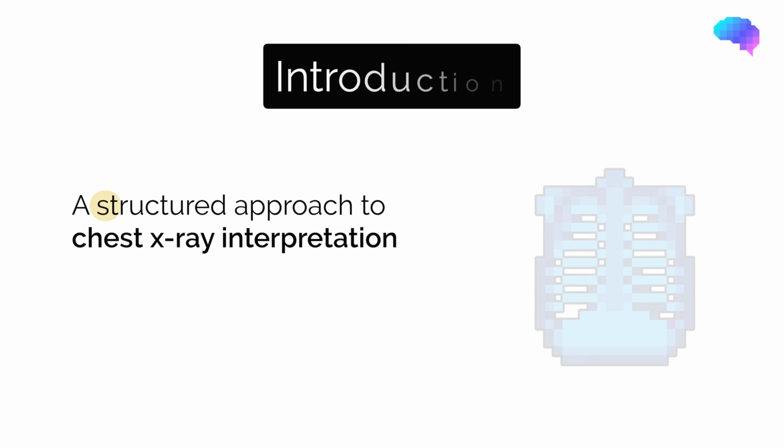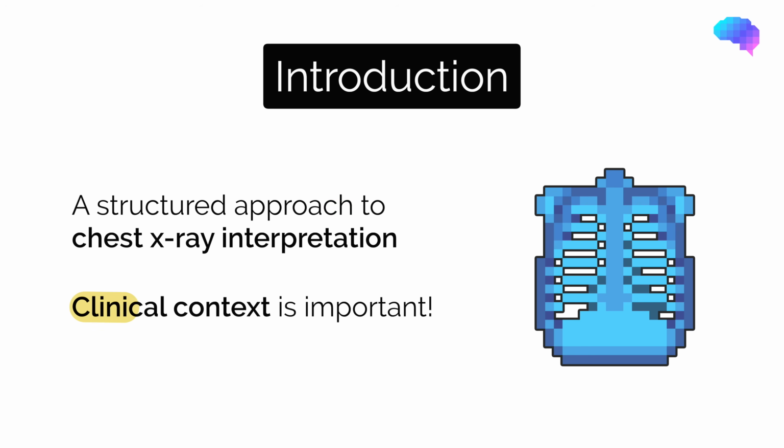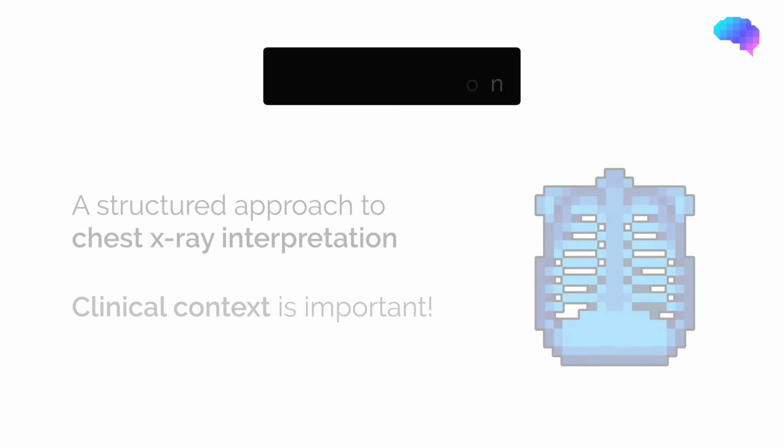In this video, I'll take you through a structured approach to interpreting any chest x-ray. At the end of the video, there are several cases for you to put these skills into practice and test your understanding. Remember, when interpreting any chest x-ray, the clinical context is key to effective x-ray interpretation.